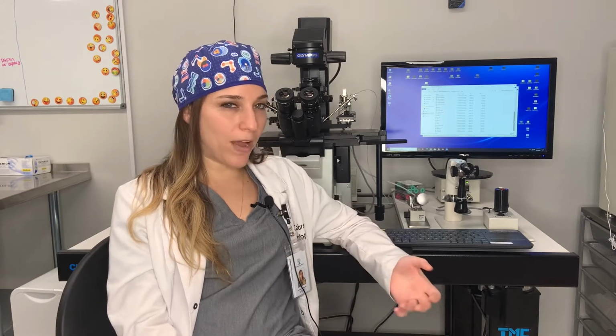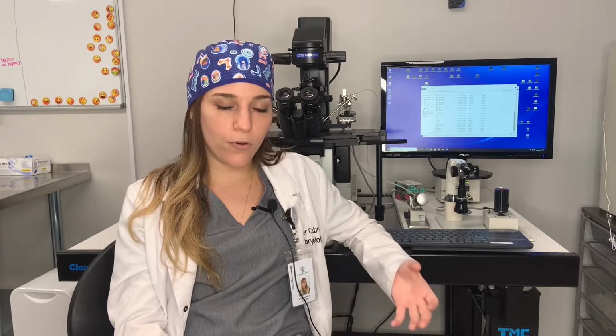Embryo grading, in a nutshell, is a way for you to, in layman's terms, understand the quality and whether or not your embryo is viable versus non-viable, usable versus non-usable. It's kind of a metric system that allows you to better understand how the embryo is growing and progressing. Embryo quality is super important.